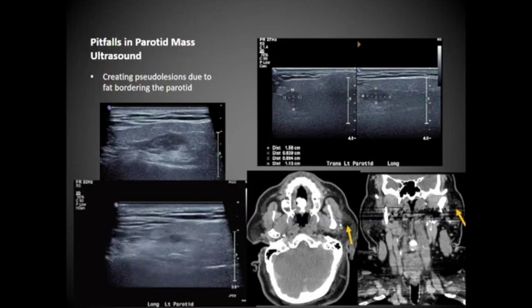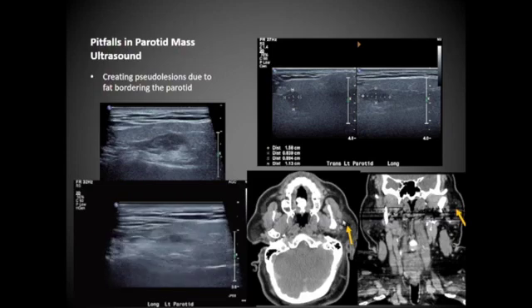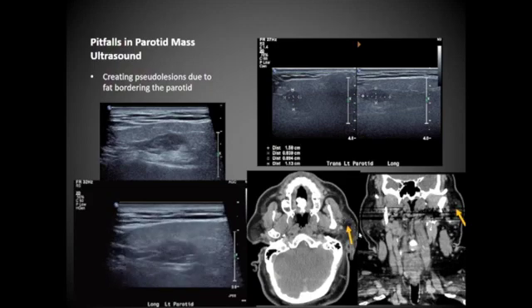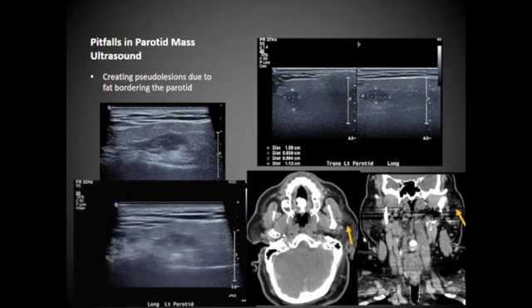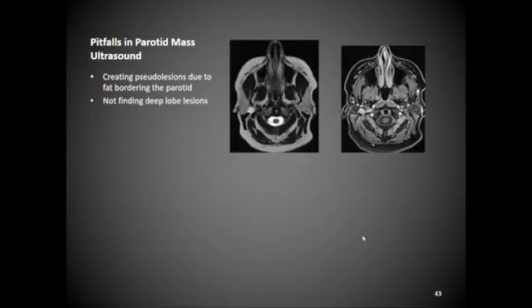It actually, this CT isn't great because of artifact, but it's this little bit of interdigitated adipose tissue, because the parotid can kind of have little fingers to it. And so this is a common pitfall. It's easy to fall into this. We probably have this issue maybe once a week in our lab. We do a lot of head and neck ultrasound, but it's a common issue.